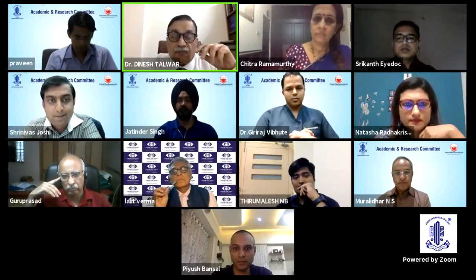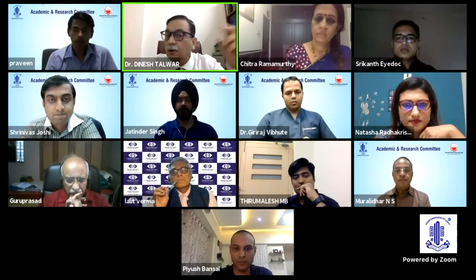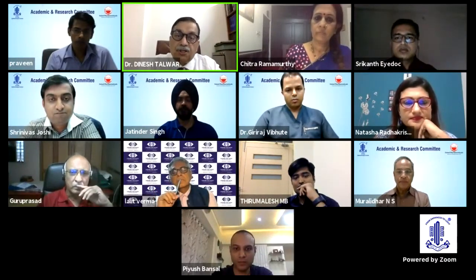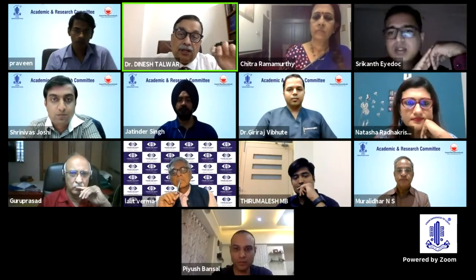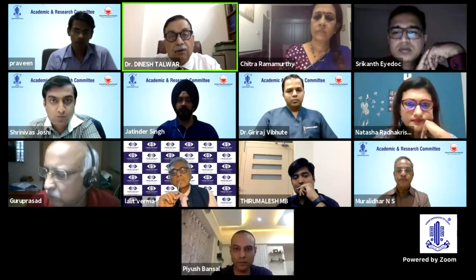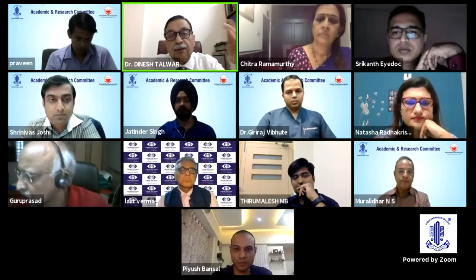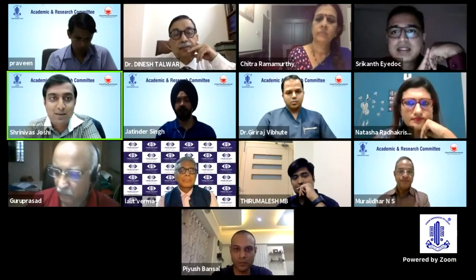Yes. If you give me only one and you don't want to give me the other, then I can only say hyper or hypo. I can't even say whether this is transmitted or increasing. So I can only comment on the fluorescein angiographic picture. I cannot comment on what comes as a functional change in terms of leak, in terms of window defect. One picture you can never comment on, and you should not. This is very important because that can be a trap for you otherwise. Very, very valid point.